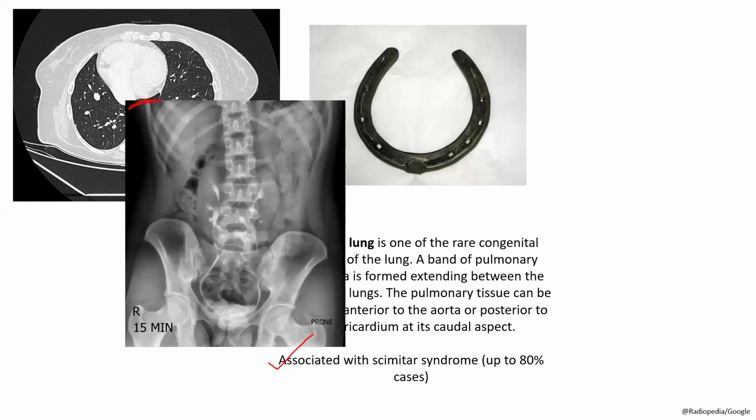When we are talking about horseshoe-shaped lung, that's a word about horseshoe-shaped kidney. So this is IVP of a patient with horseshoe-shaped kidney showing which sign? Hand holding calyces. So the calyces are basically joined together. So this appearance is known as holding hand calyces.